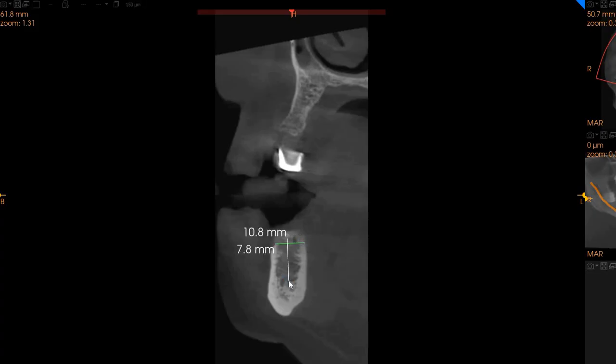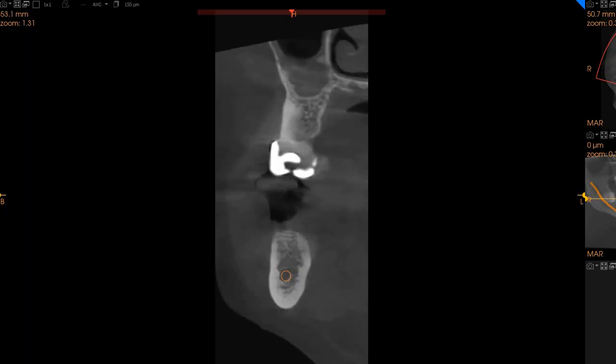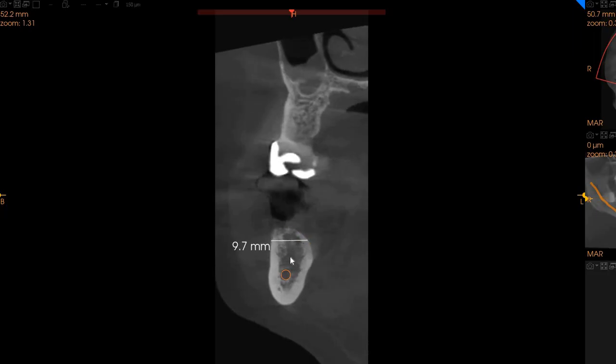Distal to that implant, the premolar region has D2 quality bone, excellent, 8 millimeters of ridge width with approximately 10 millimeters of height. And then finally, moving distal to the lower right mental foramen is the sixth region. You've got D2 quality bone, 9 millimeters of ridge width with approximately 9 millimeters of height.